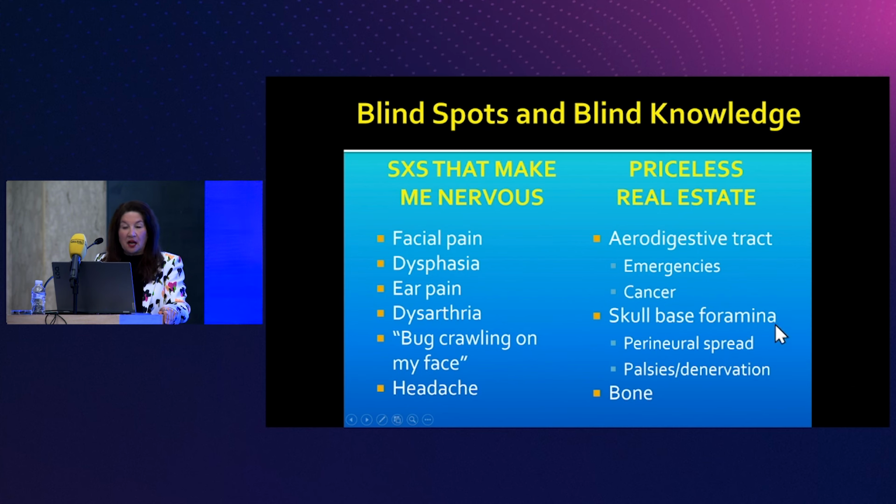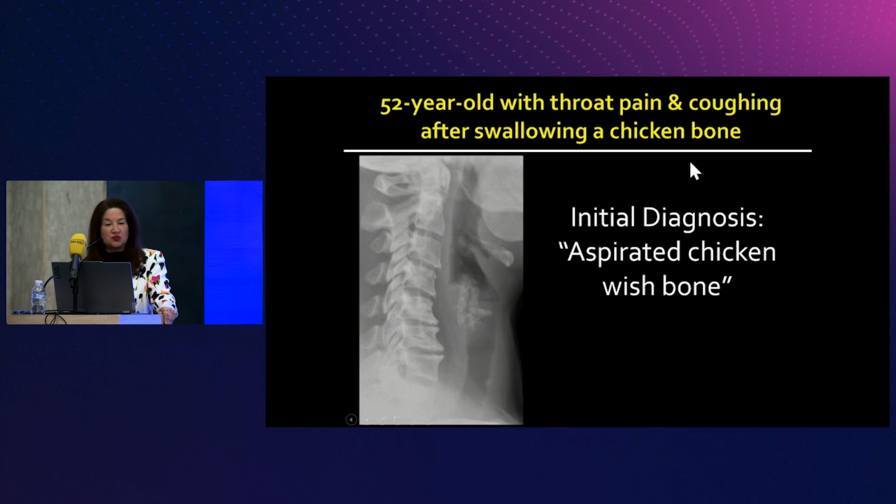Okay, that'll help you a lot. And please don't forget to look at the bones. I see so many bone misinterpretations. So here's that 52-year-old with throat pain and coughing after swallowing a chicken bone.